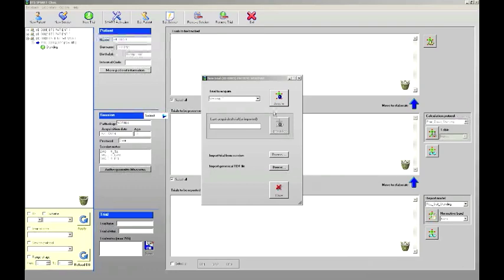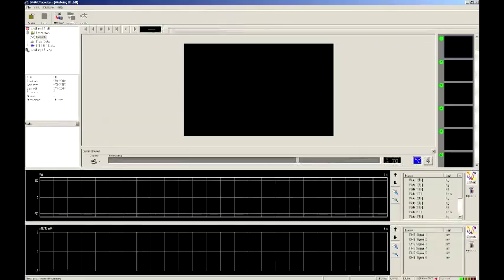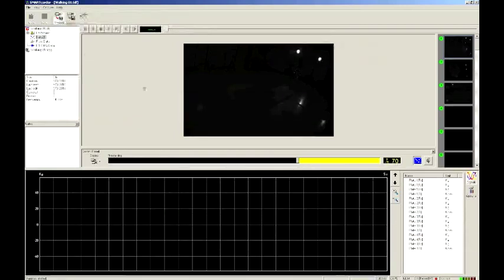Clicking on Acquire, we come back to the acquisition window. As usual, click on Monitor to switch on the infrared cameras. By the top menu View, you can enable or disable the other signals to visualize in the black live monitor window.